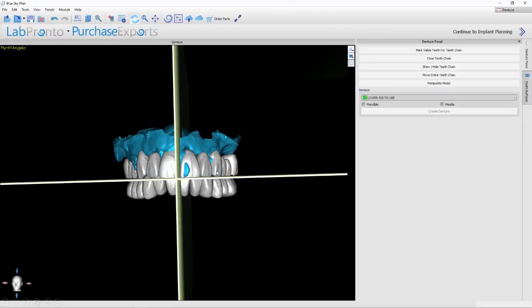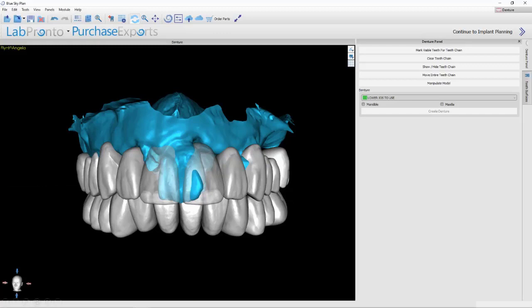And here you see me doing exactly that. I've pulled in the entire upper and lower dentition. I've dropped it onto this plane. And now, if anything needs to be done, all that will need to be done is perhaps widening the smile or the tooth setup to conform to her arches, right? It could be easier. So we'll show that in the software. And again, you see that translates to us capturing that new midline.